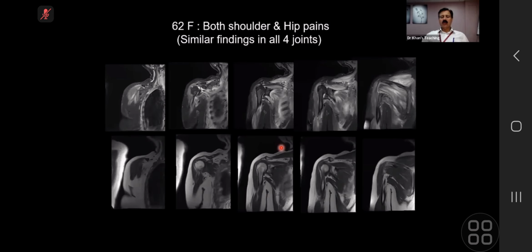Interestingly, for a clinical question of myositis, the same sequences are done, T1 and STIR. And the concept is that in your report, first of all, if there is edema, it will be high signal on the STIR sequence. And once you pick up edema, you have to tell the rheumatologist which muscles are involved.